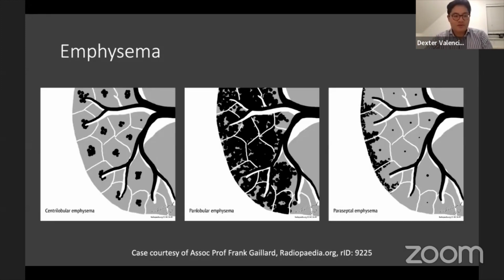Quickly talk about emphysema. We're nearly at the end, so we're just on the home stretch. So emphysema, obviously lots of smokers, you get damage to the distal alveolar airway spaces, and those become dilated and they can't exchange as well. There are different types of emphysema, but essentially it just makes the lung look a lot blacker.